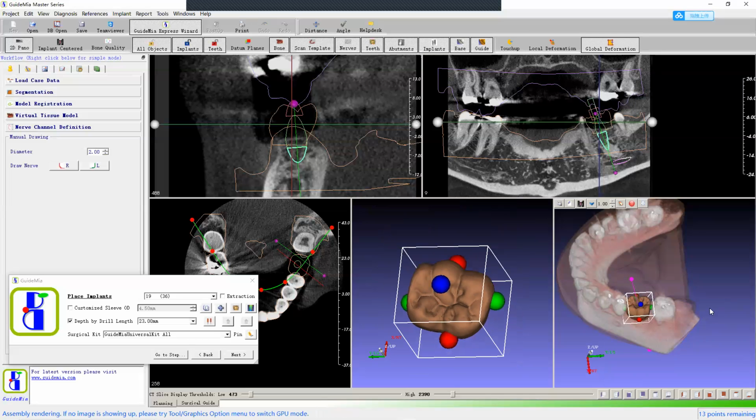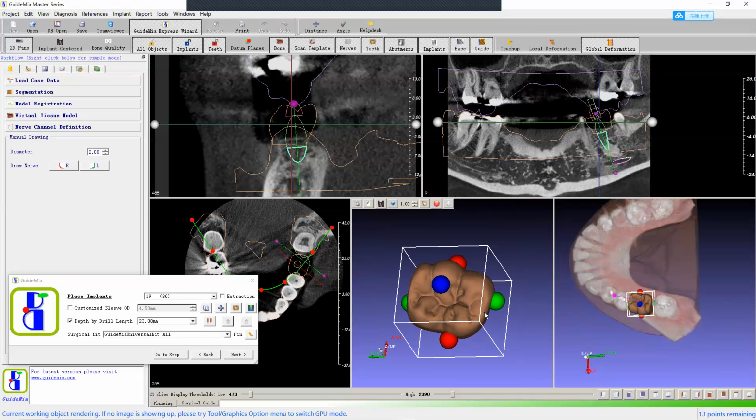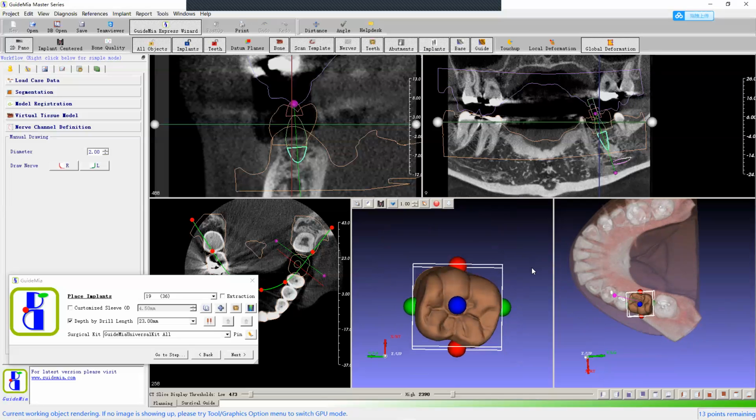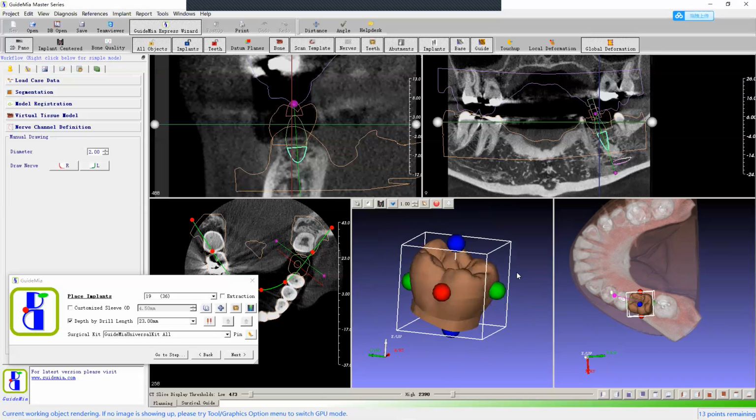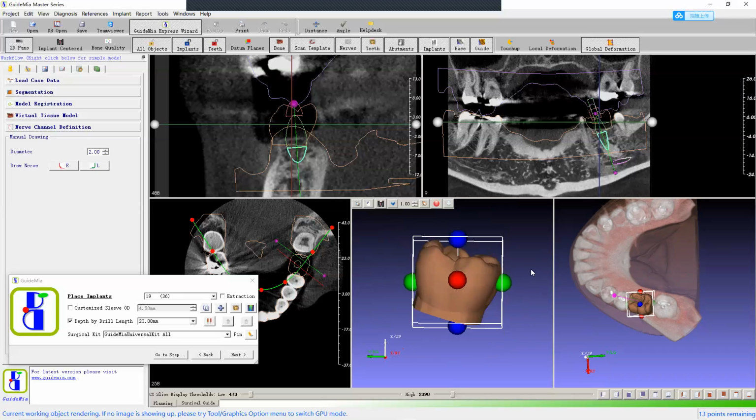There you see we have the whole tooth here. And what we do is scale the tooth along those handle directions. But the best thing to do is, first, we're not going to zoom this way. First we want to rotate the box so it's aligned with the tooth orientation.